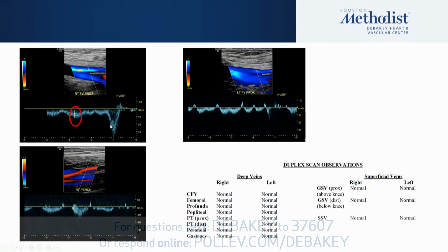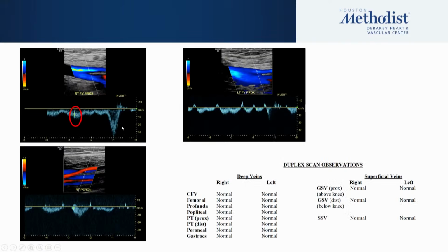This is courtesy of Dr. Zol Garami. I love this picture. I don't think I would have ever caught this, but what we see here is a microembolic signal. This is a patient with sickle cell disease who came in and was having some issues.